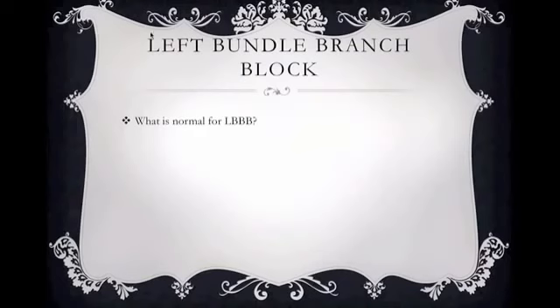Well, left bundle branch block. That is the L of our mnemonic. The bane of every paramedic's existence. A patient with left bundle branch block. We don't have old EKGs to compare. We don't know if this is old or new, so we have to presume that it's new unless the patient is absolutely astute on their diagnosis, so they might be able to tell you they have a left bundle branch block. But unless you can see an old EKG or the patient has their history written down, you have to presume it's new, and then gotta call a STEMI.